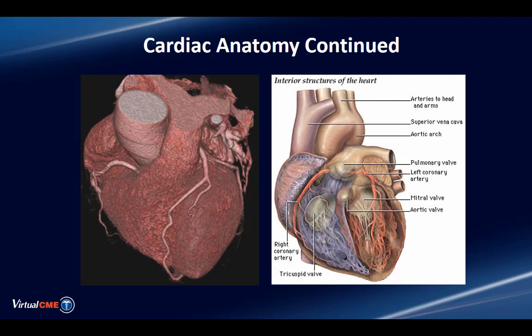This will become familiar as you begin to manipulate the images yourself. But just to show you the familiarity and the fact that we don't have transparency in a lot of these structures that we don't actually see because they're not actually contrast enhanced.